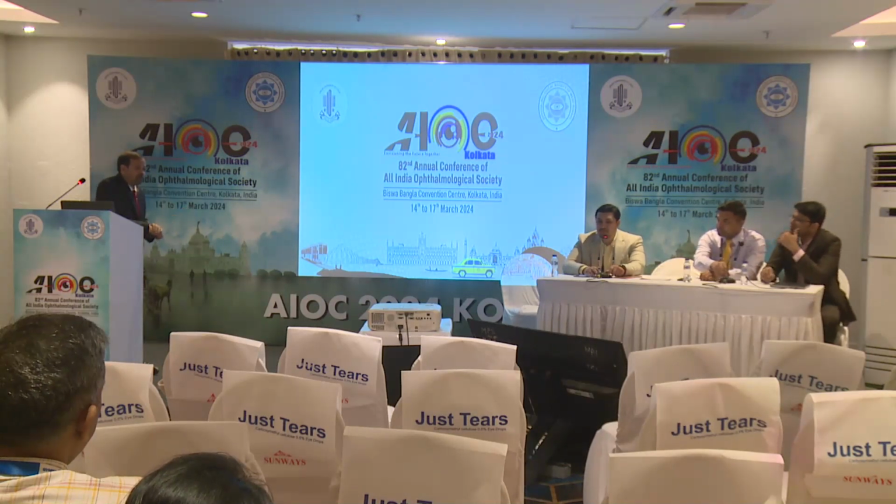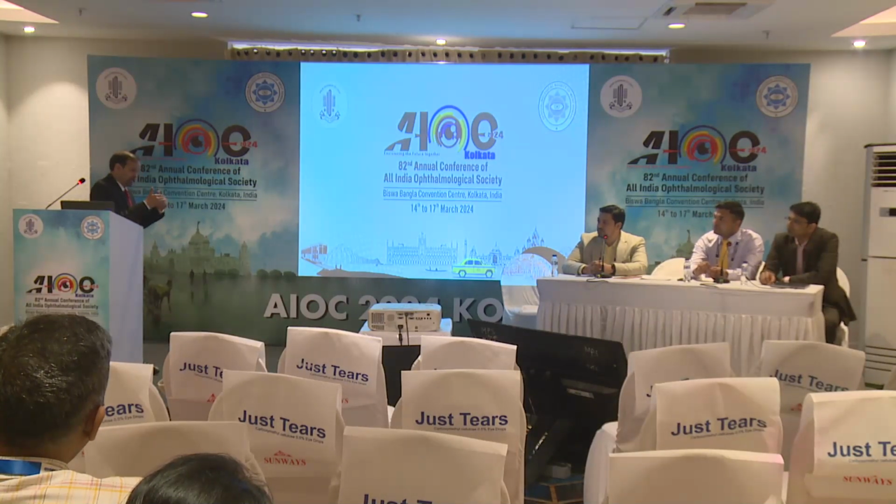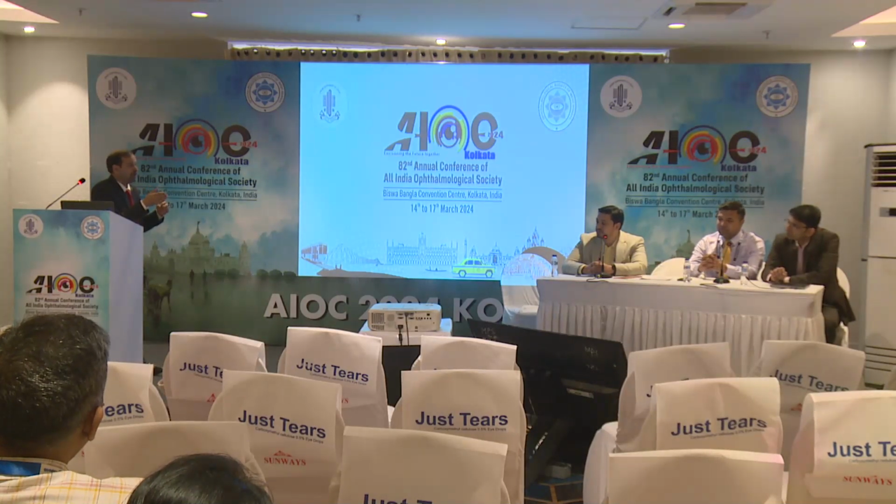Yeah, that is one problem with OCTA. I think the repeatability is a little dicey as of now. The measurements are different for different machines. What you see, actually, we don't know whether it is true, because in a lot of software developments, in trying to make the image look beautiful, they feed in a lot of data so that the gaps are filled in. So that's why a lot of these images will actually not show what is actually there.